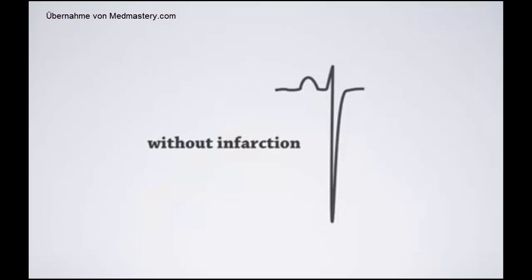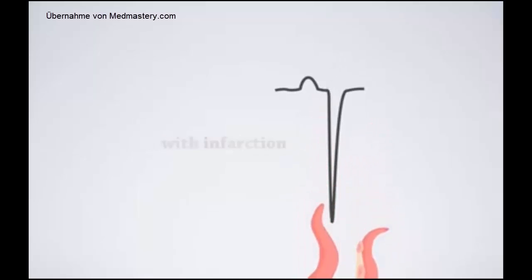Let's look at another example. In this example, something very similar happens. The QRS complex drowns in negativity. It gets pulled downward so that the initial R wave gets lost and we end up with a QS complex.